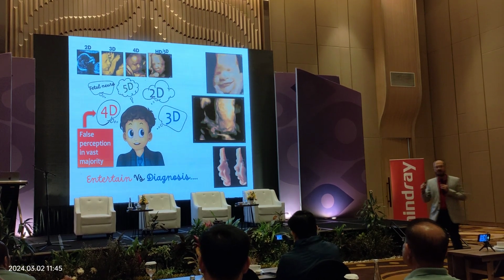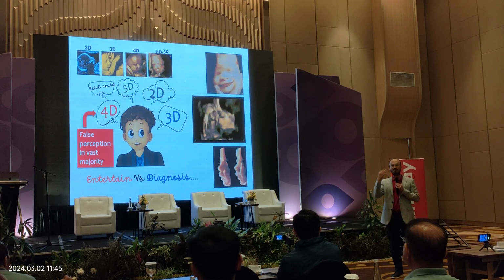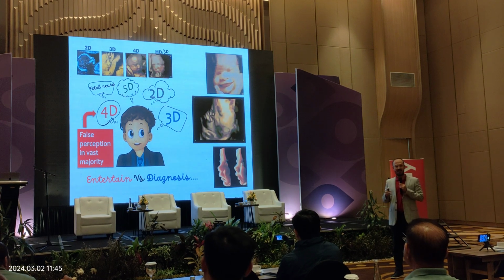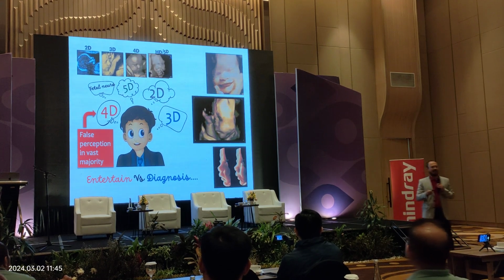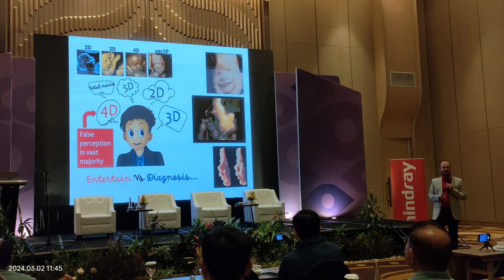If we are using an HD, high definition machine, and we can pop out the image so that it looks like this, the patients look happier, so we call it 5D. But does it have any potential influence for making a diagnosis? How about 4D? Is it necessary for diagnosis?